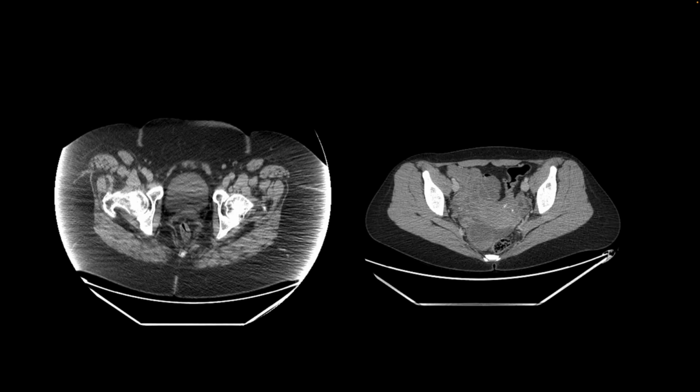This is our first slide where I'm showing you CT scans from two different patients to describe CT-related artifact. Here in the region of the pelvis, where there are pelvic bones, especially at the level of the hip bones, there are a lot of artifacts in the region of the bladder. That's because of the attenuation caused by these bones, and because of that there is an artifact because there are not enough counts. A lot of the x-rays are being stopped by these hip joints as they try to reach the detectors on the other side. So this is a common artifact from photon starvation.